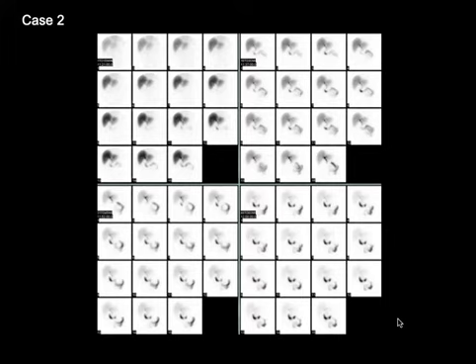And we want to give them either morphine, some more tracer, 1 to 2 millicuries, and acquire additional images for 30 minutes, or the other option is to wait for a few hours, up to 4 hours, and then acquire delayed images to see if the gallbladder lights up. Now in this situation, we gave this patient morphine and acquired post-morphine images, which are seen here, 10 minute, 20 minute, and 30 minutes post-morphine. There is no cystic duct or gallbladder activity, confirming a diagnosis of acute cholecystitis.